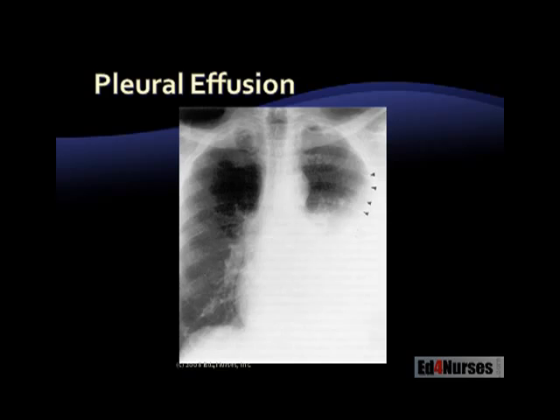Here a patient has a pleural effusion. Okay, now notice on the left-hand side of your screen, that right lung, nice and fully expanded. We've got nice diaphragmatic arches, costophrenic angles, but look at the right. On the right side of your screen, which is the left lung, we lost half the lung there, right? Now, how do you know this isn't pneumonia? We know it isn't pneumonia because we see the pleura pulling away from the chest wall.